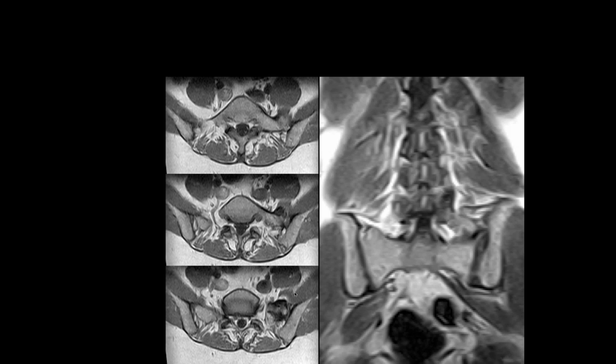Okay. Looks like an abnormal articulation of L5 with the sacrum on the left, and some sclerosis of the bone around it. So what does this mean? It can be painful because that abnormal articulation can develop degenerative changes and be painful. Yeah, this can be a cause of pain. We'll see other examples later.